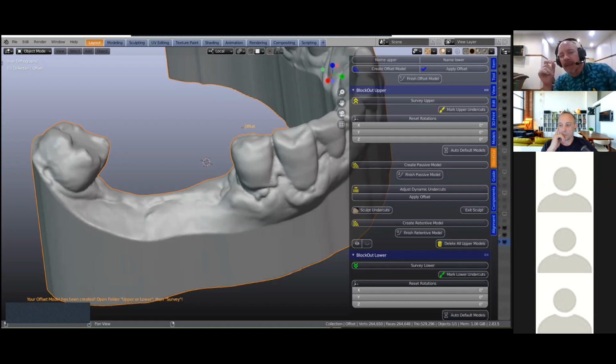For example, if you've got an MIS sleeve, some of them are hexagonal and have anti-rotation, which makes it a bit difficult. But if you've got an outside diameter, you would set the drill diameter, as we did earlier, to that specific diameter of your sleeve, and then it should fit. I understand. Okay, thanks. Good. All right.